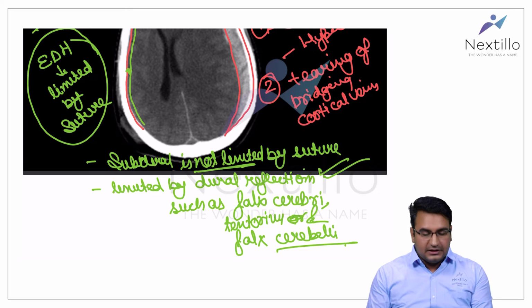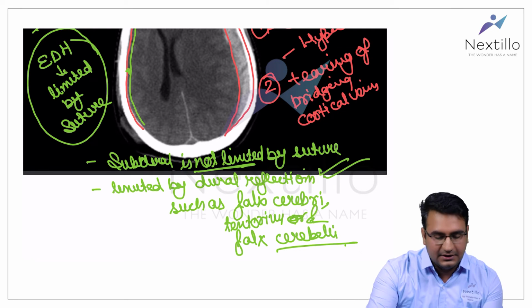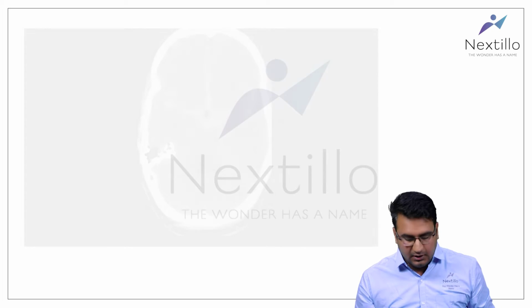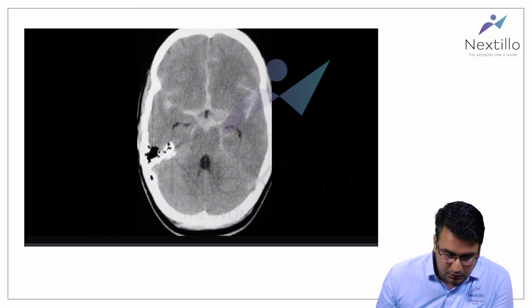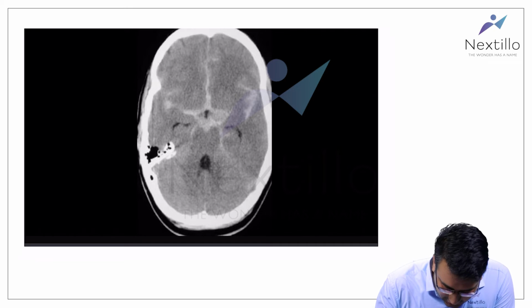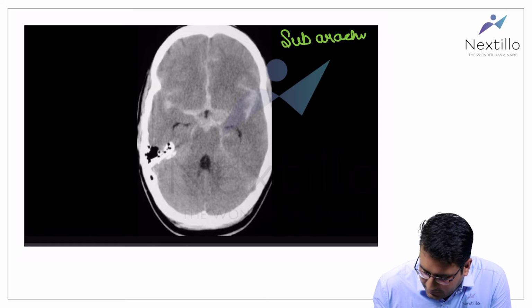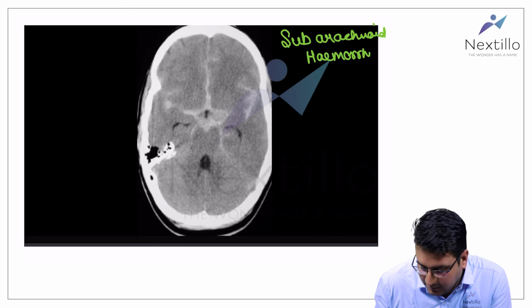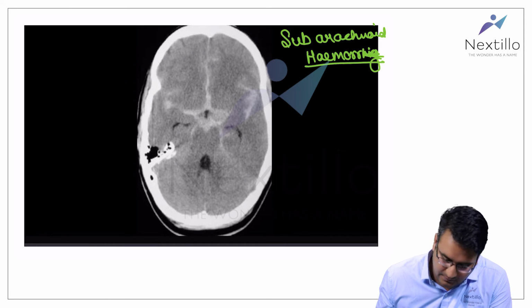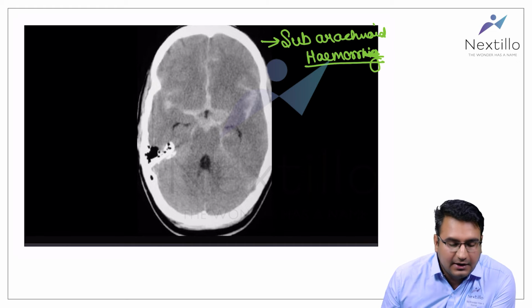Okay, so these are the important points regarding the extradural. We have covered the subdural. Then the next is subarachnoid. Just look at this image and try to make a diagnosis. Okay, so this is subarachnoid hemorrhage. So the first type of question will be the diagnosis. Okay, the first will be the diagnosis. It is a subarachnoid hemorrhage.